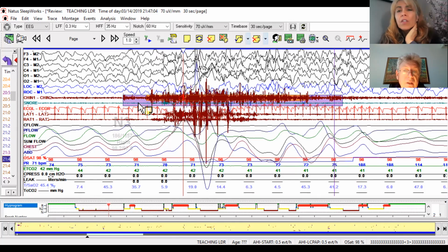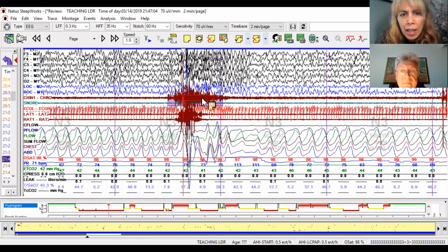Okay. And so I want you to comment. When you see this study, which was just picked as a teaching study, you see that the tech has scored, let's delete our scoring of the leg movement, but the tech usually scores these studies as arousals, right? Yeah. So I think here, this was the previous study was as an arousal.